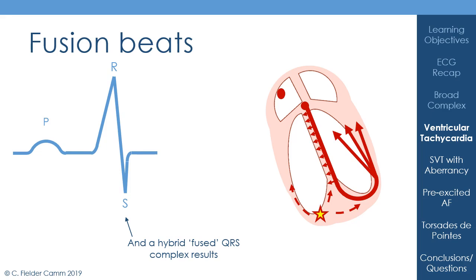So it won't quite be as wide as the ventricular tachycardia beat, but it won't be completely normal either, and so you get this sort of halfway house.